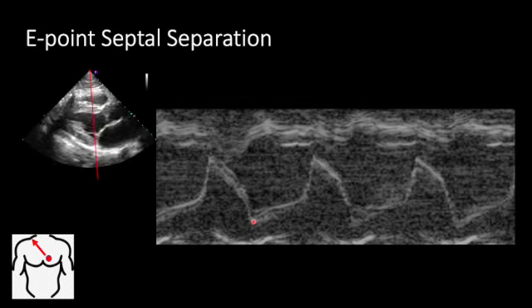So what this reflects is that in diastole, at the very early diastole, or E, the valve slams open as blood starts to rapidly enter and fill the left ventricle from the left atrium. Then we start to see a slowdown in that blood until we get our atrial kick, and then suddenly the valve closes during systole down to its closed position down here. So let's talk about what each of these points mean one more time, just visually.